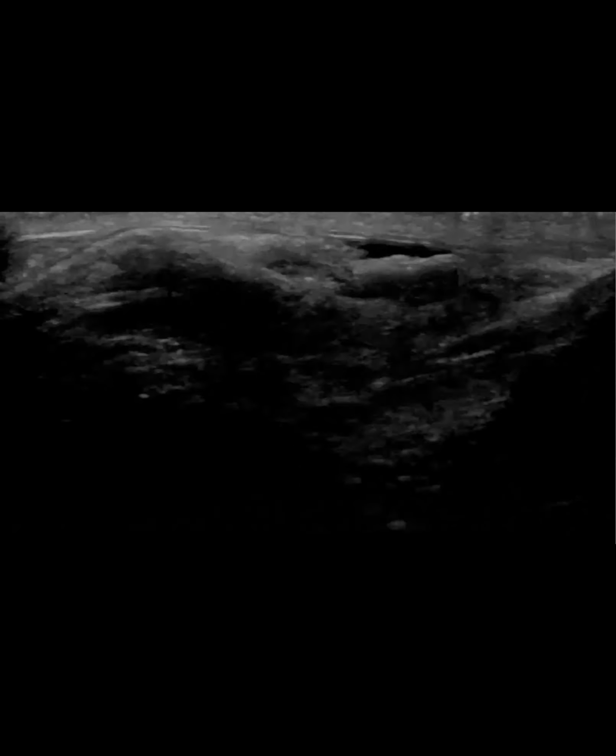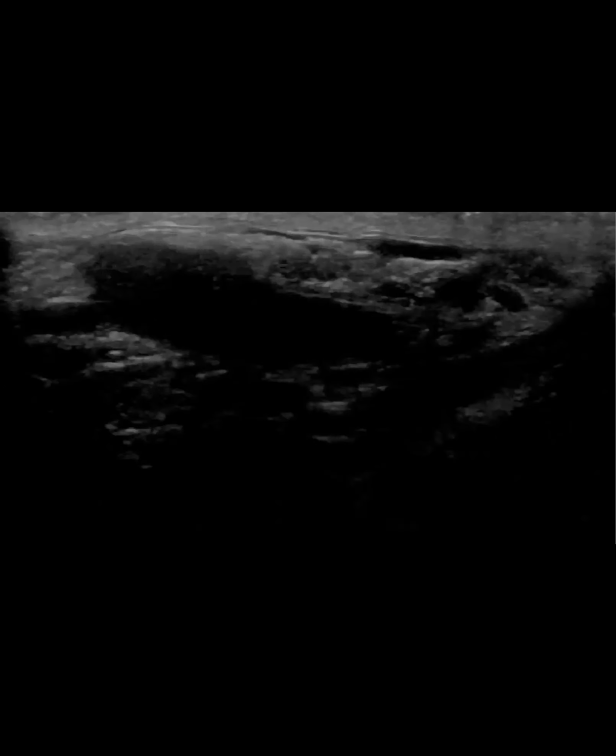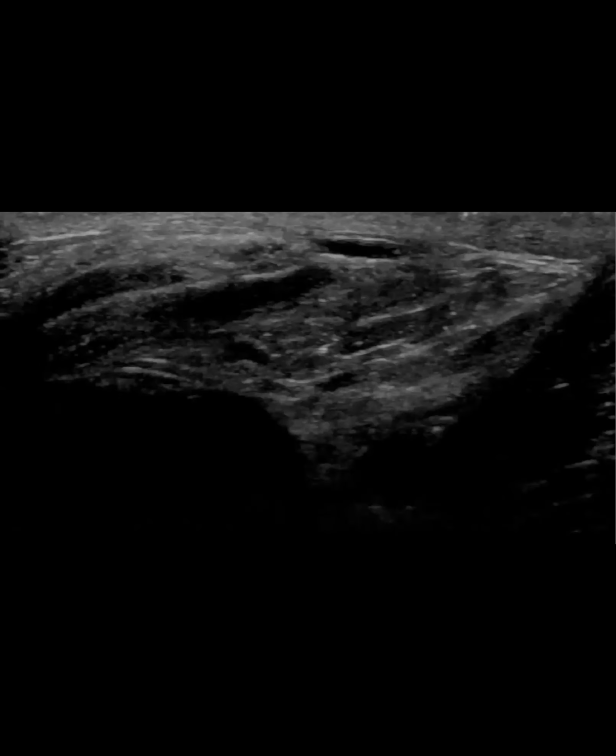Very cool. What was the patient's age? 26. So that's a decent tumor type to go after if you're strongly suspecting a paraneoplastic syndrome. I might not have thought of it, but somebody did. I have seen a couple of burnt out tumors that look like this, where you get mets in the retroperitoneum or chest, and the primary tumor is burnt out like that. So beware the hypoechoic looking, almost dead looking mass.